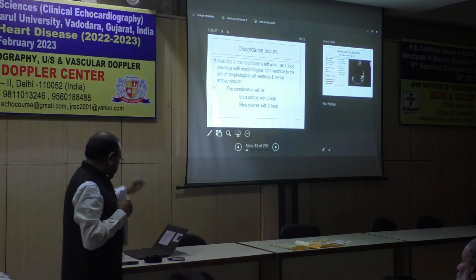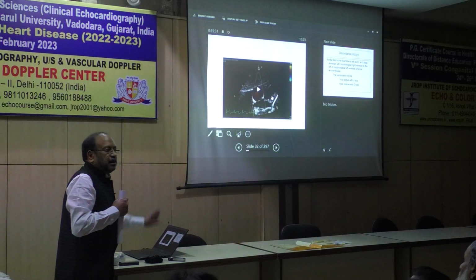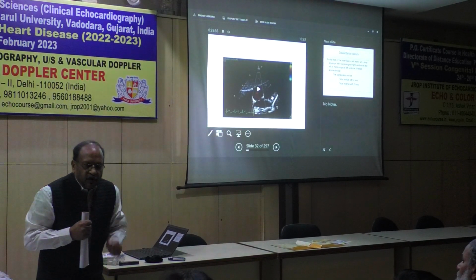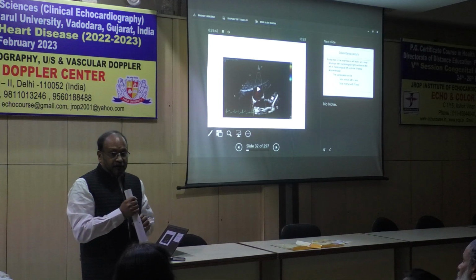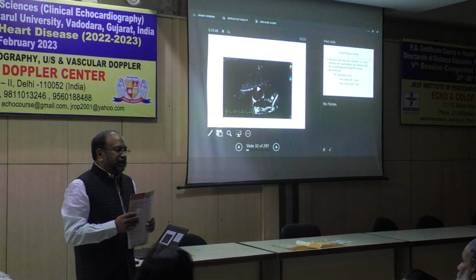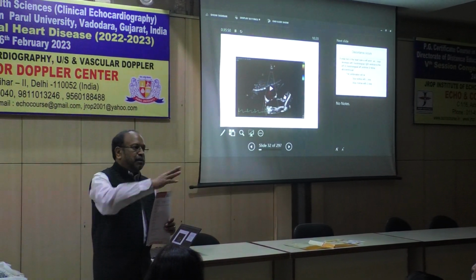So the first picture, if you are doing a pediatric echocardiography, is you identify how it opens up your views. Because this is the most important thing to begin with. Otherwise, I've seen many people when they talk of a situs solitus, D loop, L loop, they make many mistakes right from the beginning itself.